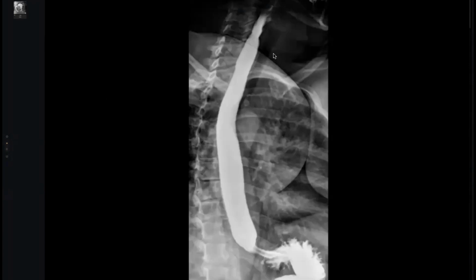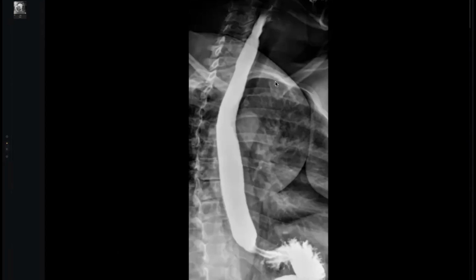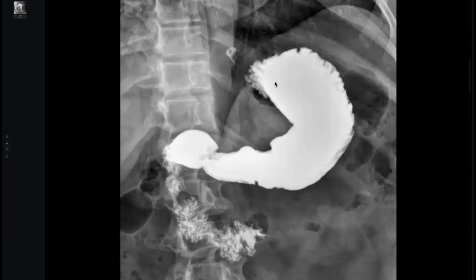See, my colleague, I am tracing the contrast from the beginning. I also saw this, all of us inside the exam. Really, we are making many mistakes. I think I saw one case like this, but I wasn't reporting, and I expected it was a static image. Then by luck, I don't know how, I discovered it. It is not static. It is a serious, very big mistake on my side. So look at any case, especially in reporting, because in the viva the examiner will give you a notice: Doctor, this is not a static image like this. And scroll one by one.